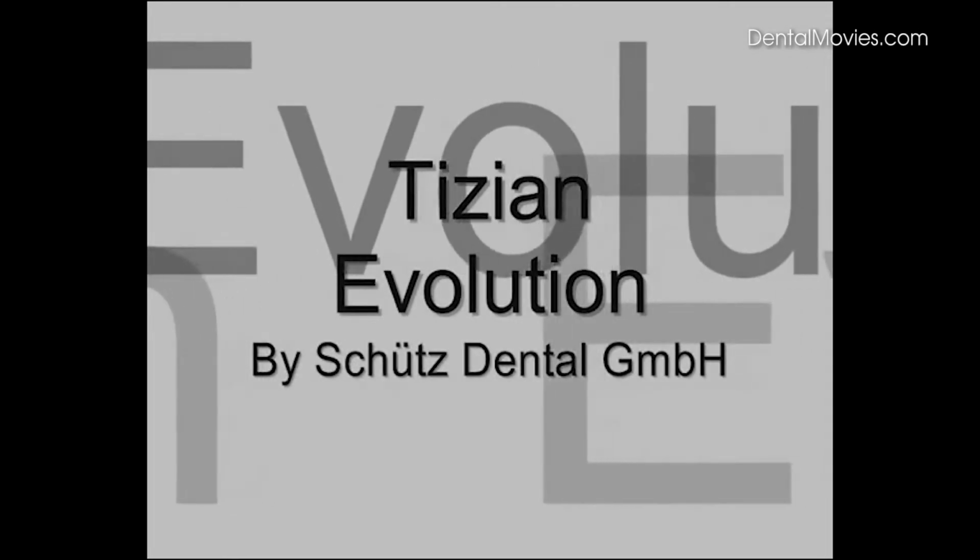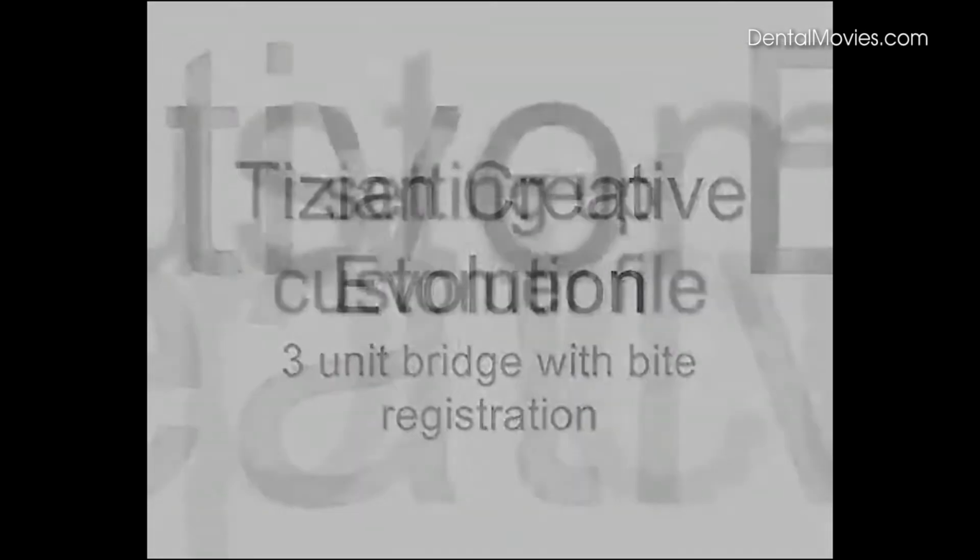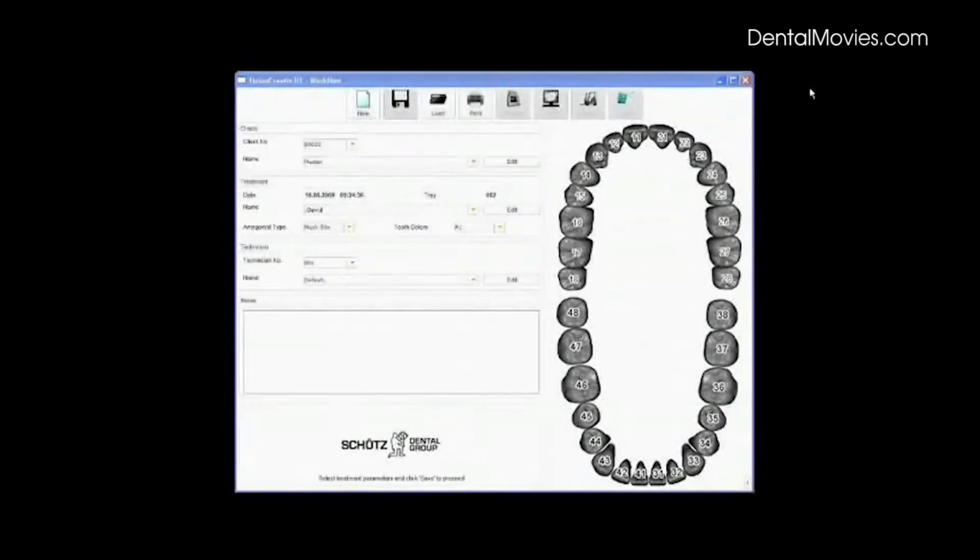The new Tizian Creative Evolution software by Schütz Dental. First step is setting up the custom file. Here the program guides you step by step through the complete procedure.